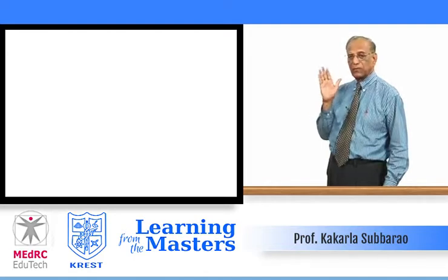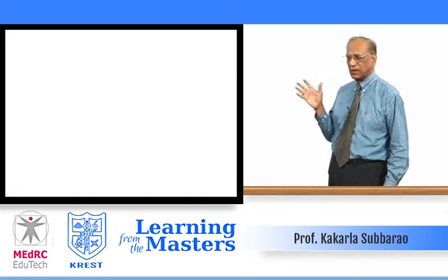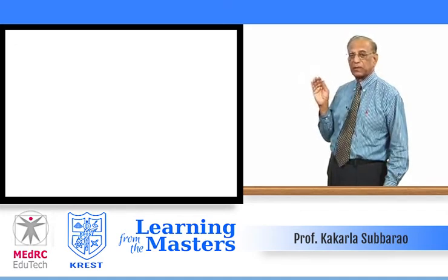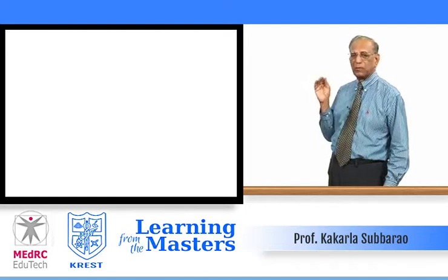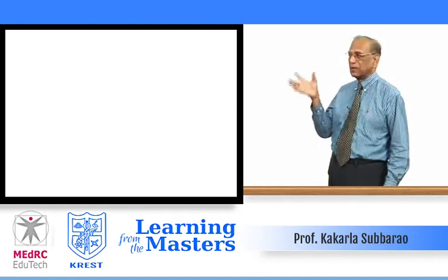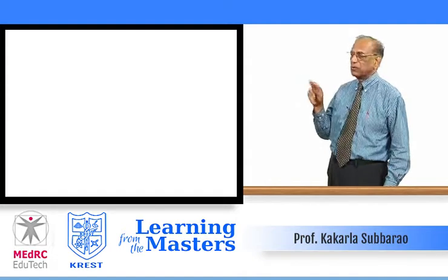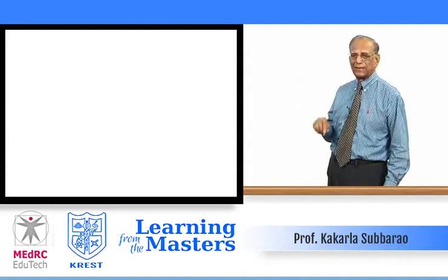Notice the mediastinum is fixed, although there is a space occupying lesion on the left side, because of invasion of the mediastinum. That is a primary radiological diagnostic point to think about a malignant mesothelioma of the pleura. Supposing it is a lung mass with involvement of the pleura, then because it is a space occupying lesion, the heart and mediastinum should be shifted to the contralateral side.